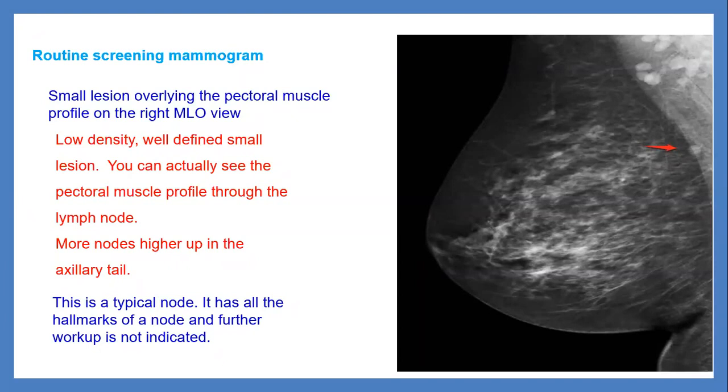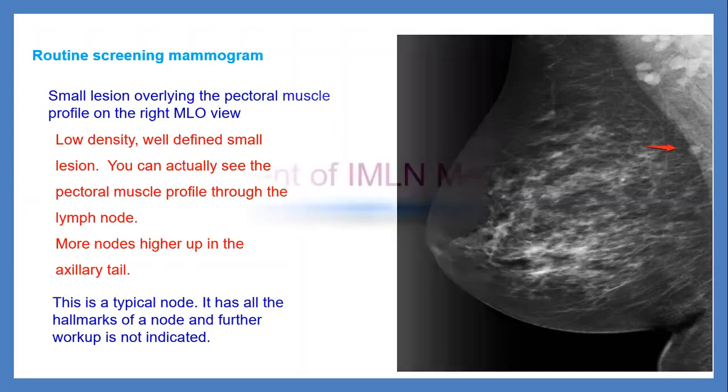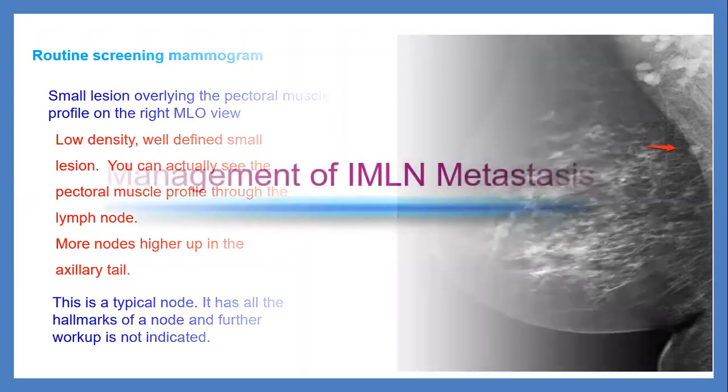But because the lesion is low, and by location and the same lymph nodes in the axilla, and the constellation of all findings, you will go for just intramammary lymph nodes, okay? You can put your probe just to reassure yourself that this is a typical type of lymph node.